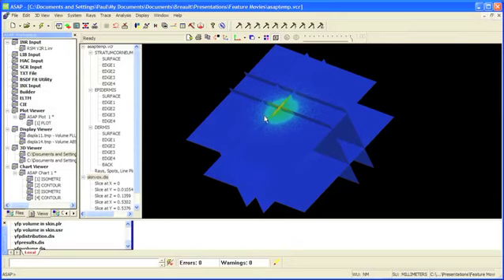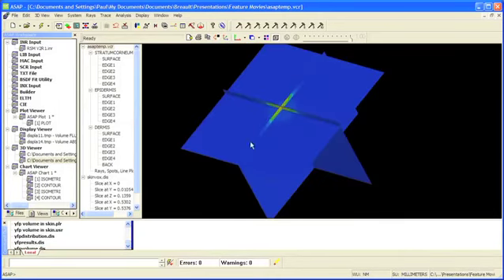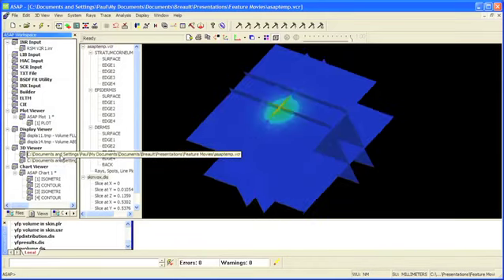Now let's compare this to the same trace with tracking absorption in the skin. And we can see that there's a marked difference between the energy absorbed in the skin and the amount of energy flowing through the skin, or the fluence in the skin.